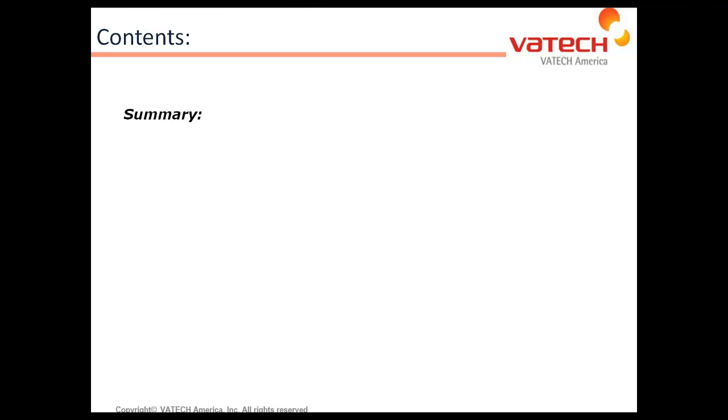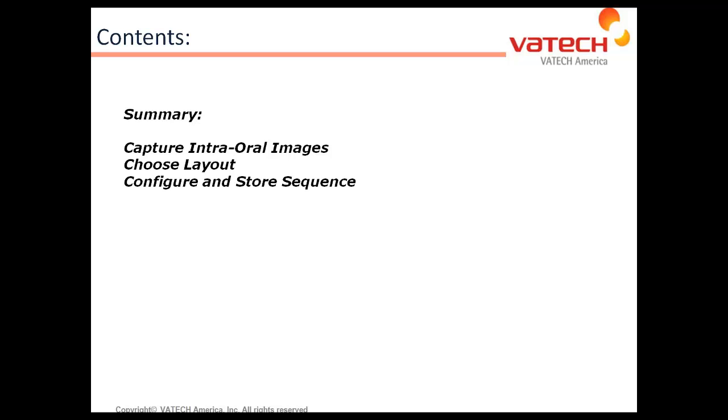In summary, you should now be able to capture an intraoral image, choose a layout, configure and store a sequence, start auto sequence, save captured images, and do retakes.